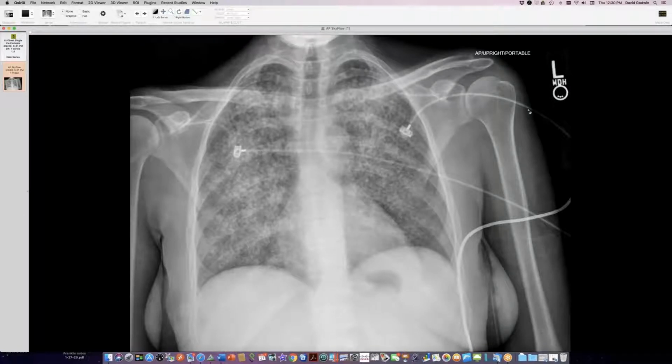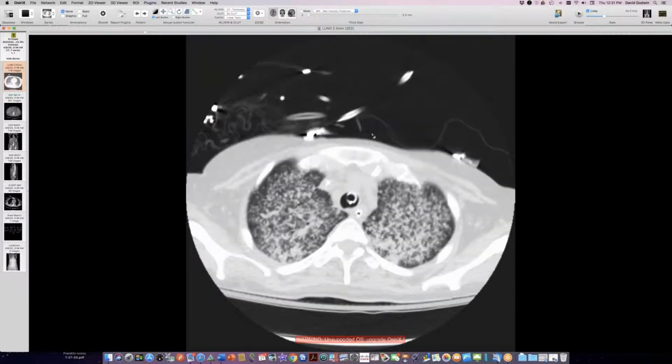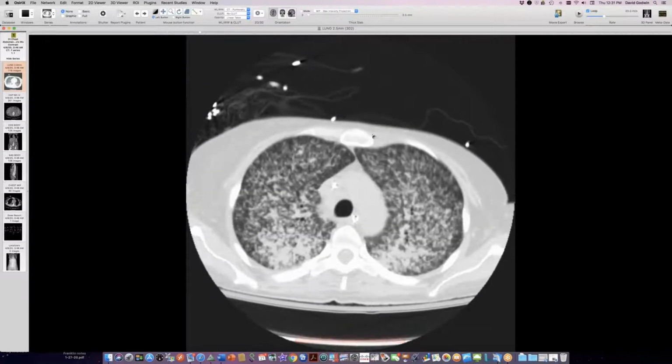I hope people can see this chest radiograph here with diffuse lung disease with an ill-defined nodular component to it. This is multiple drug-resistant tuberculosis in an African patient. I haven't looked up the history in detail. And because people don't trust radiographs, they want CT scans, I'll show you a CT so that you'll believe that the lungs are diseased here.